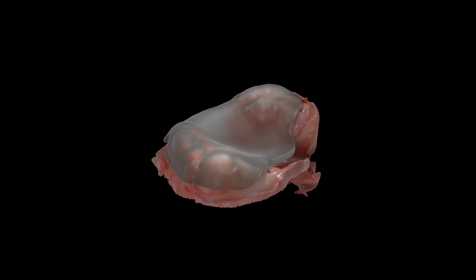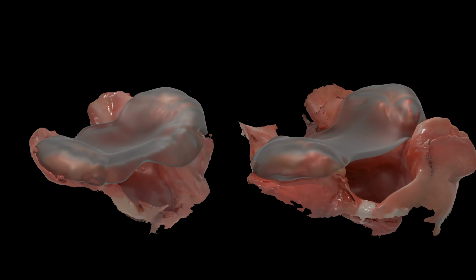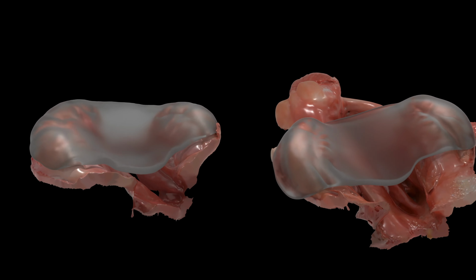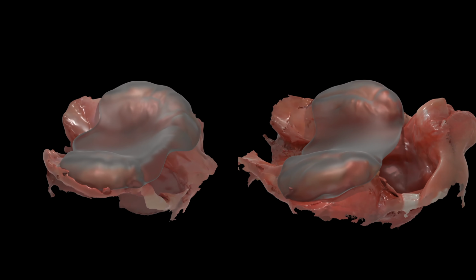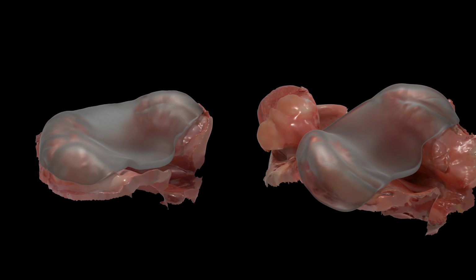The University Hospital of Basel collected a large dataset of both unilateral and bilateral cleft lip and palate intraoral scans and digitized plaster casts. The pipeline and its parameters were optimized on this dataset in close collaboration with multiple cleft care professionals. Many parameters are still user adjustable, as already demonstrated.